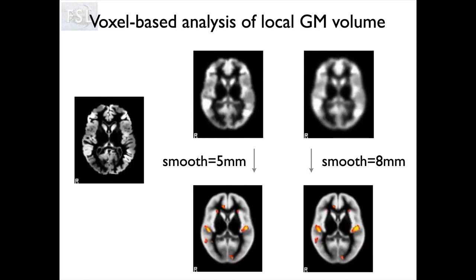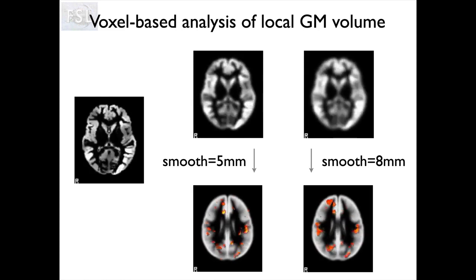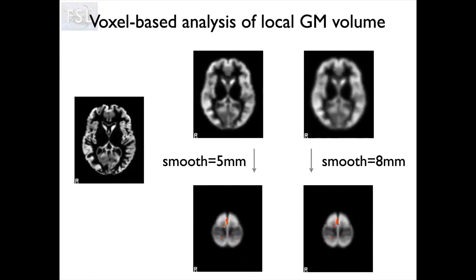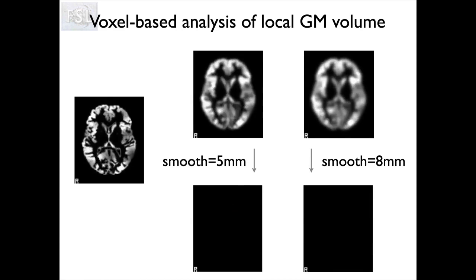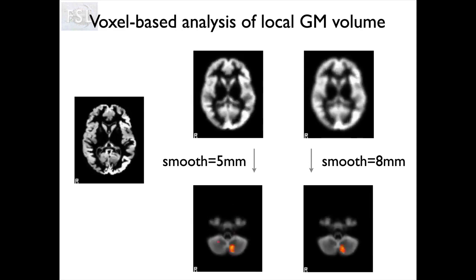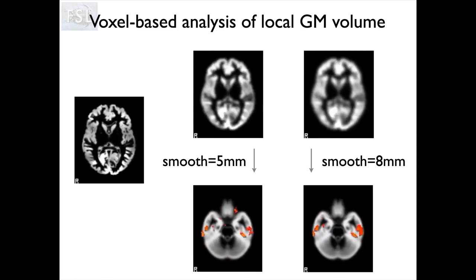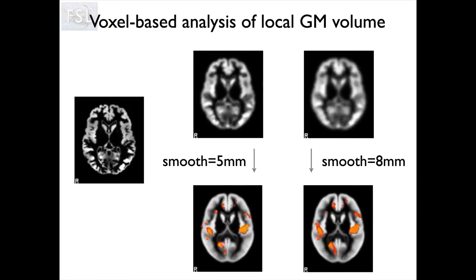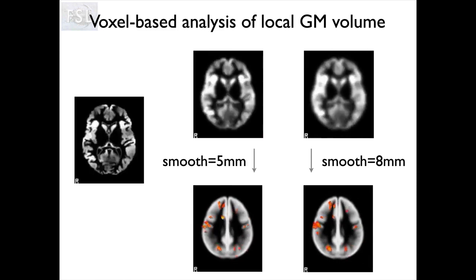But it gives you an idea of what is consistent there, and then what you might see at the different ones. Each smoothing is valid. No one is more correct than any other, but smaller smoothings will be better and more sensitive to smaller areas of change. Larger smoothings will be better at detecting larger areas.